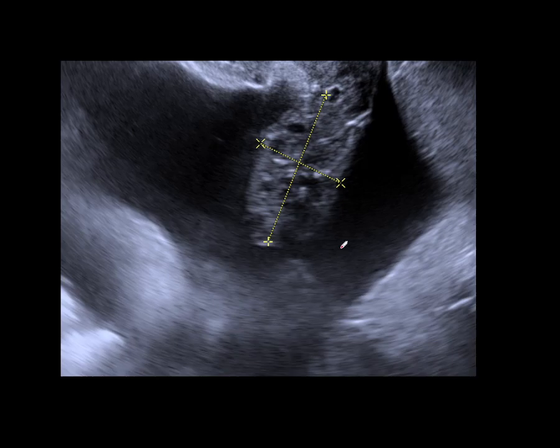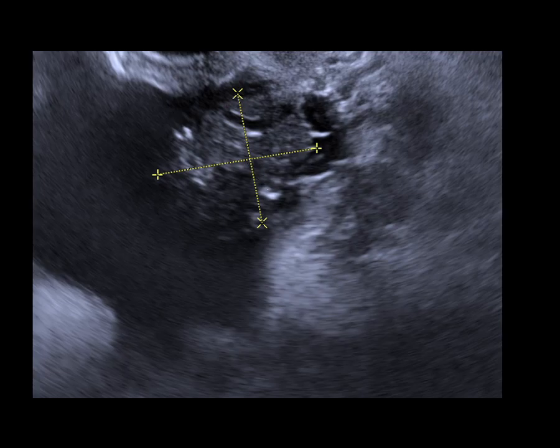This patient I think had some bloating. She came for a scan. Ascites was noted, so immediately, of course, there was a query as to whether the patient had an ovarian malignancy. These are the ovaries. So this is a rather normal looking ovary here. It's only a couple of centimeters in size. It's got a smooth border to it, and this is just normal looking ovarian stroma.